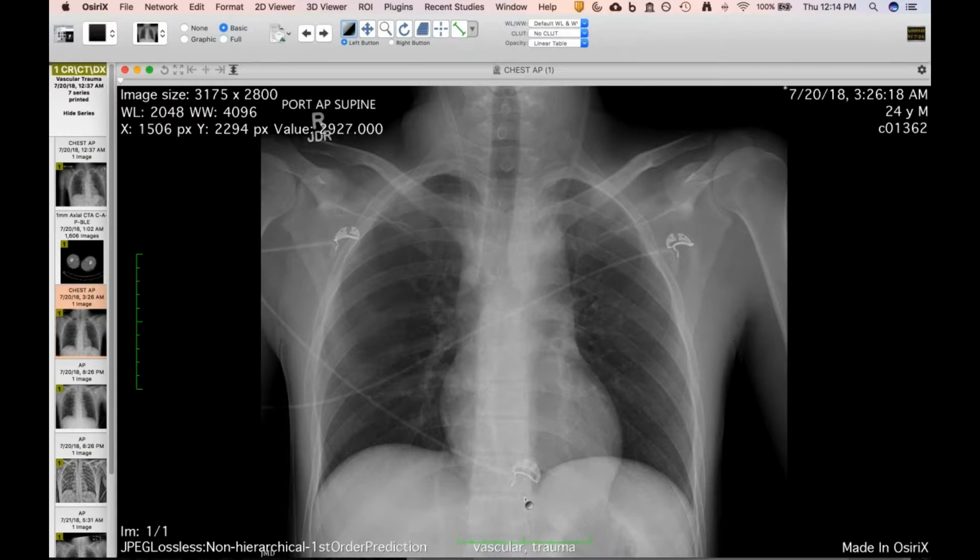His lower extremities were the most severely injured, but you can see on this radiograph here that especially in the setting of trauma, we have several abnormalities in the mediastinum. Notice that the aortic knob, where the aortic arch is not well seen, and you lose the AP window. It looks like you've even got maybe a little hematoma along the descending aorta, and then certainly there's rightward deviation of the trachea. Yes. All findings that would suggest that this patient could have acute traumatic aortic injury.